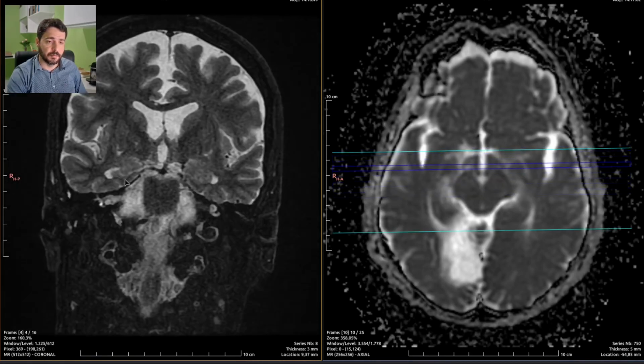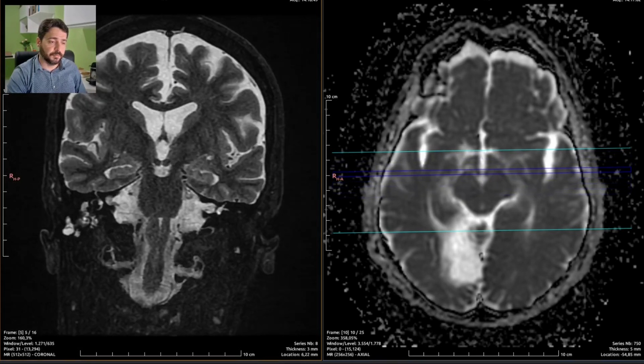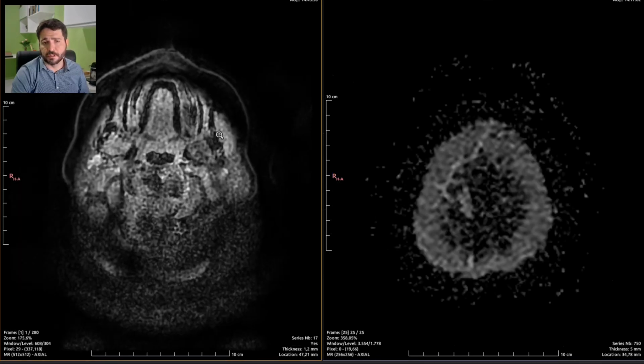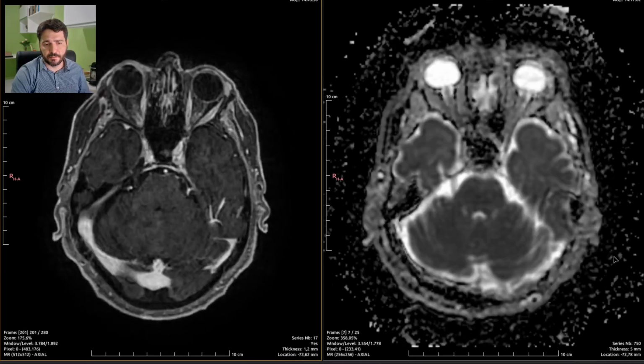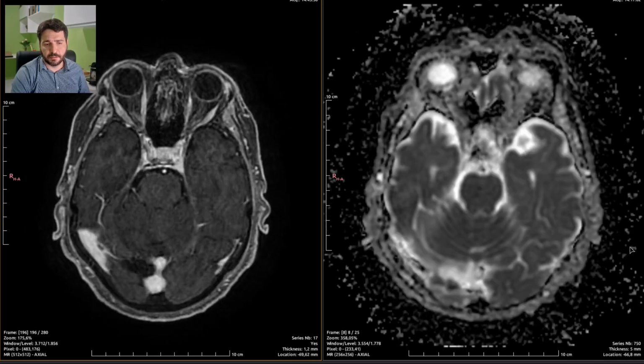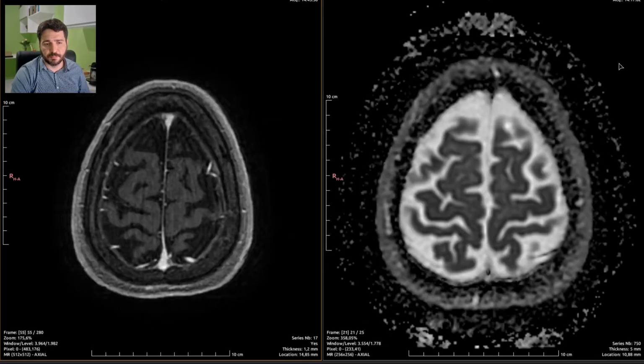So, hippocampus are fine, and we can report this exam. Oh, they say here they had a contrast enhanced phase, and they do. They have a volumetric post-contrast acquisition, which of course takes a lot, and the patient always moves a bit.